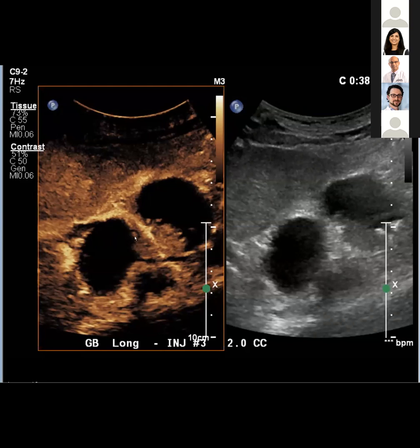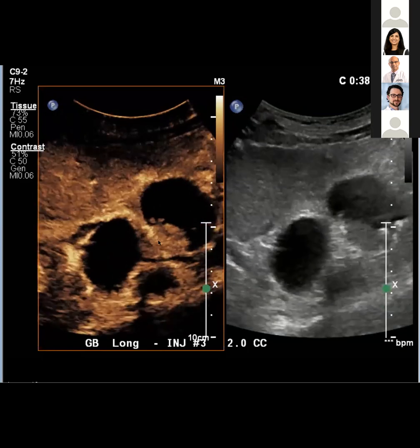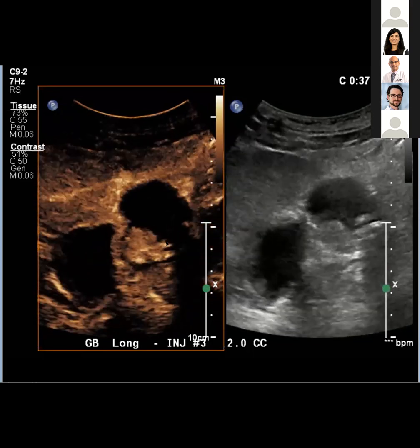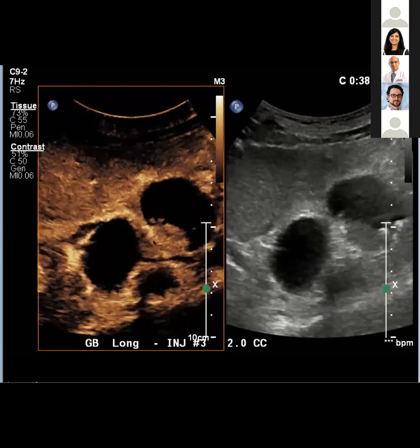But I don't. The resolution looks much better than that. Yeah, the resolution is definitely better because it adds more contrast. Just like in CT, contrast adds resolution, obviously, and there's subject contrast. Then there is a difference there. It definitely adds more. You can see the conspicuity of it much better.